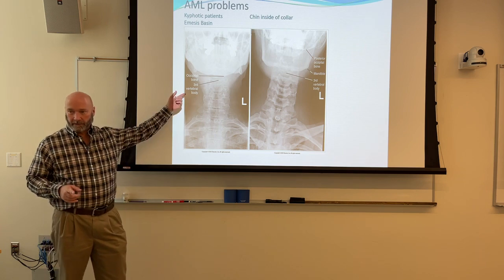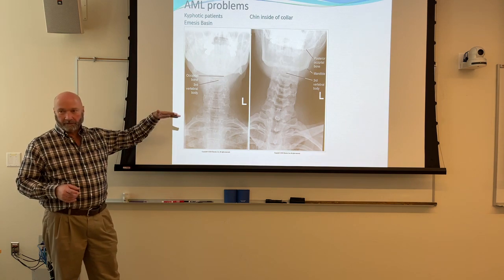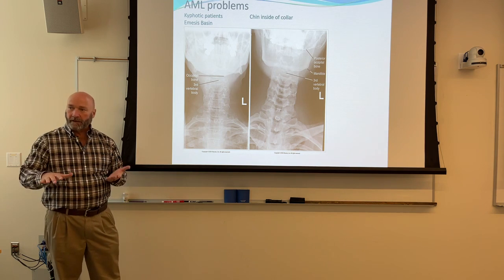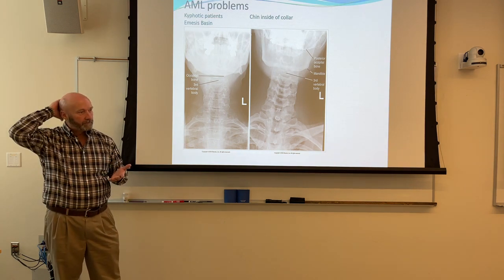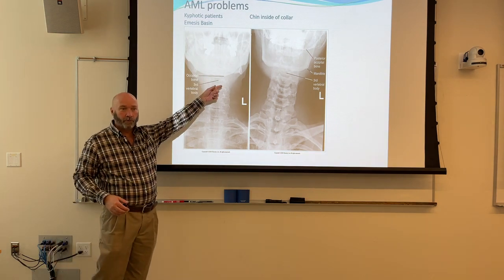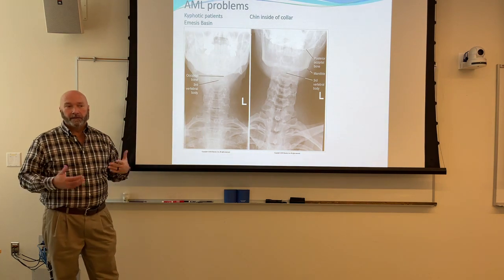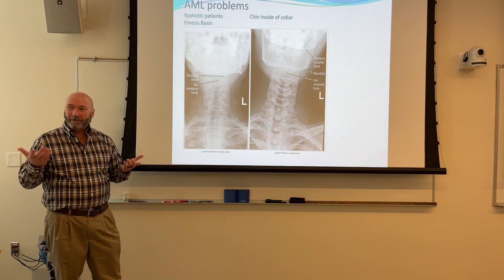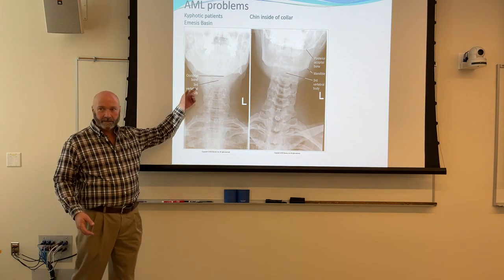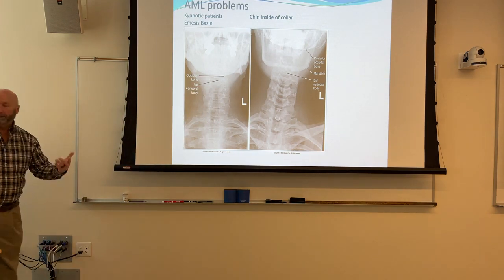But the one thing it's good for is this. It's plastic, so it's radiolucent. The only thing I've ever found good about that thing is that you can turn it upside down, put it on the table, put a towel or a wash rag over the top of it to provide a little bit of padding, and put the patient's head on. And most of the time, it will bring the patient up to where their acanthomeatal line is pretty close to being perpendicular. Okay, so you might have a little bit of increase in OID, so a little bit of magnification, loss of sharpness of recorded detail, but it's not going to be as ugly as that, right? So just, you know, hopefully.